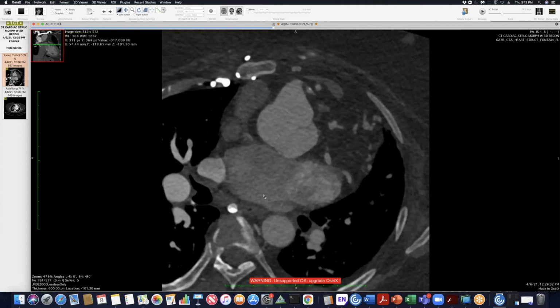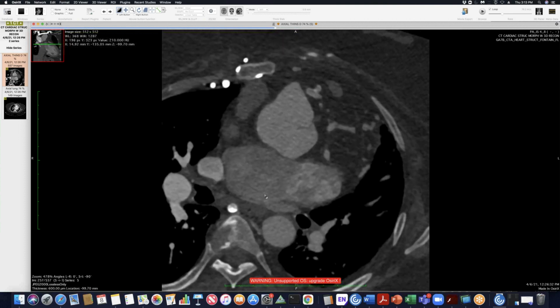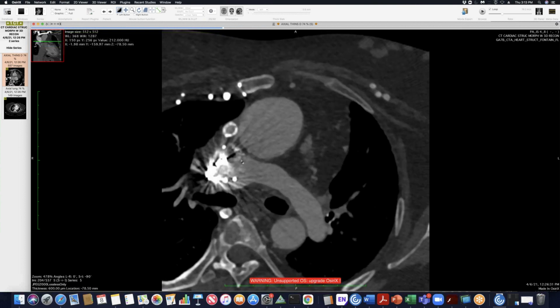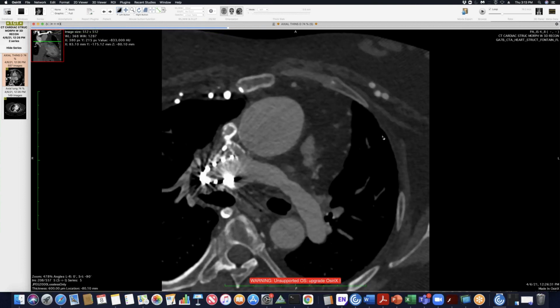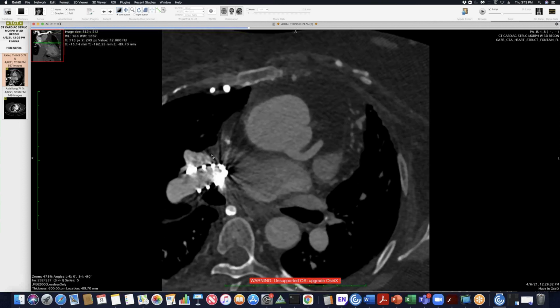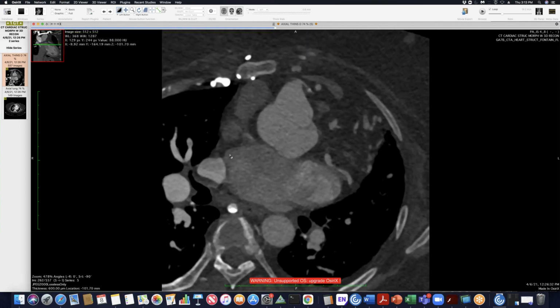So that's another right to left shunt. So we have the POTS shunt here, which is right to left, and then these shunts here in the lungs, predisposing the patient to cyanosis.